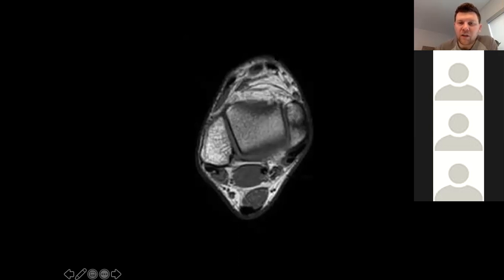As we move out anteriorly, kind of everything along the same way. One of the only major nerves, if you want to split in quadrants and remember where all the nerves are, we had which one's back here? That'd be sural. Good. What's over here? Posterior tibial. Okay. What's over here? There's saphenous. Okay. And then what would be over here, a smaller one that's really hard to see? Yep. Finish saying it. Superficial peroneal. Okay, good. All right, who wants to go next?